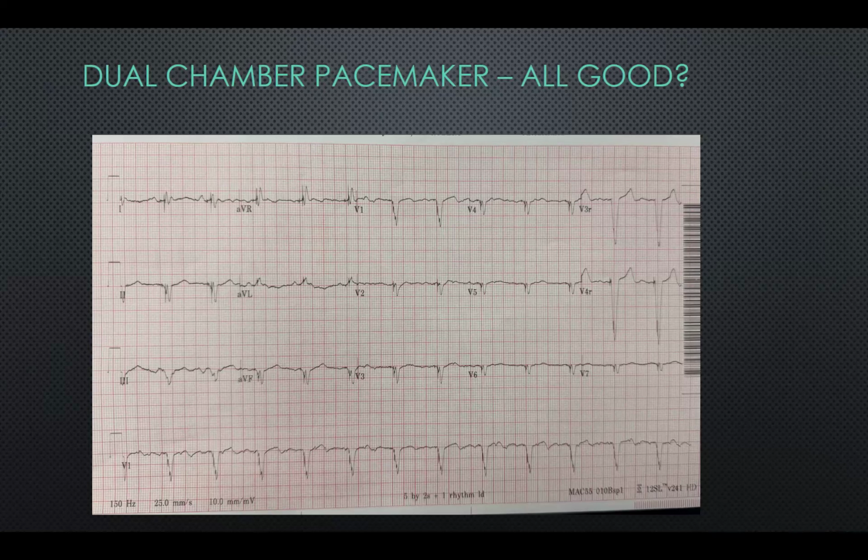Nothing sticks out to me as abnormal quite yet. It looks regular. It's not pacing spikes consistently, but it looks overall like I see a P wave followed by a paced ventricular beat. So this actually is a challenging tracing.